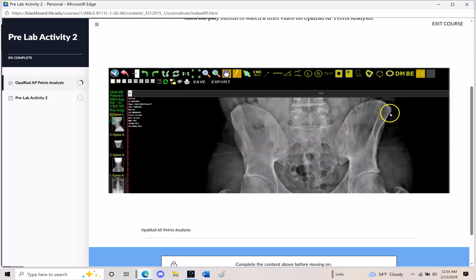We should be on number 11. Most lateral aspect of the right. I like that. That was number 11. Now we got 12, the top of the femur head. And then 13, top of that femur head.